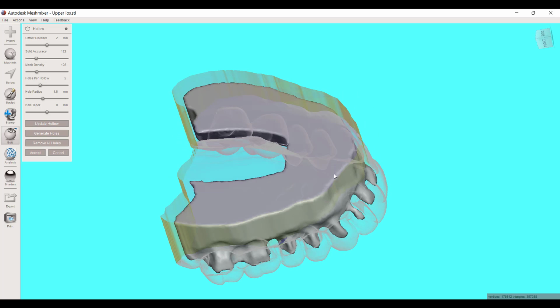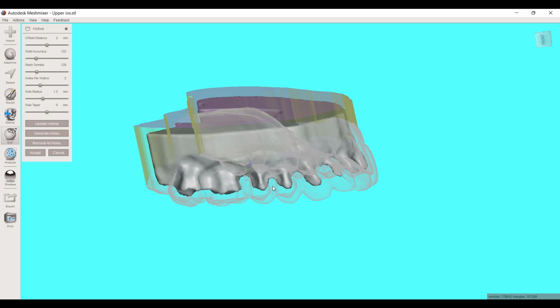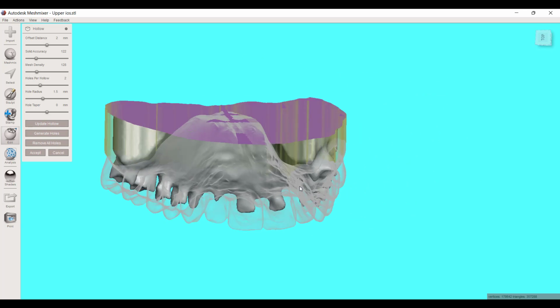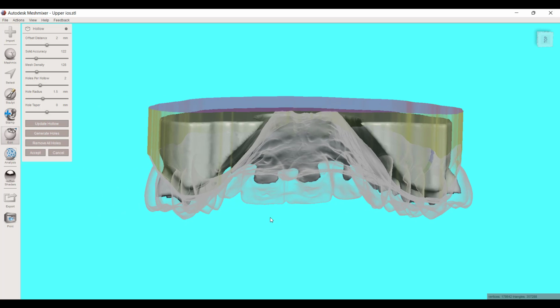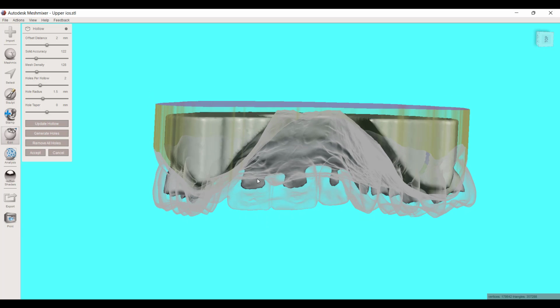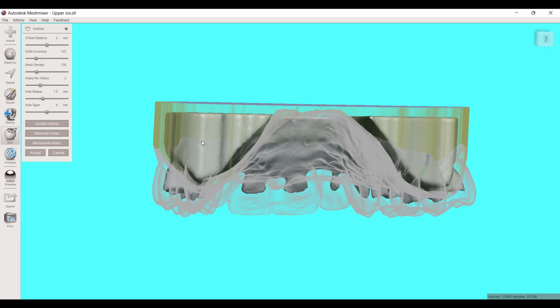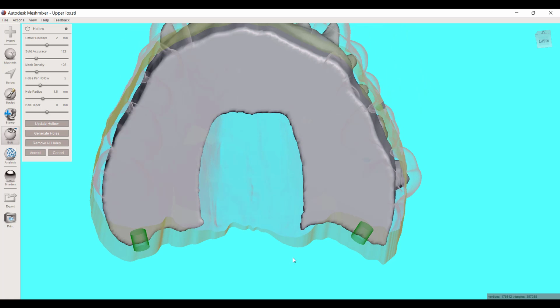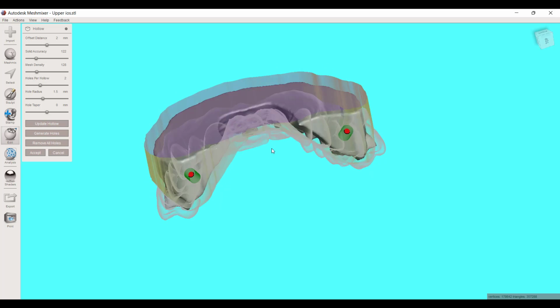and now you can see all of that little interior that you're seeing through the transparency, that's going to be air now. Now the one thing about that is that if you hollow this but you don't have anywhere for that excess resin to escape, you can still end up wasting a lot of resin just by the liquid that's going to get stuck inside of here. So I always like to include a couple of drain holes. So you could just double click here, let's say on the heels of the model, and those are going to end up being drain holes so that that excess resin has a place to drain out and you're not going to waste a lot of resin.